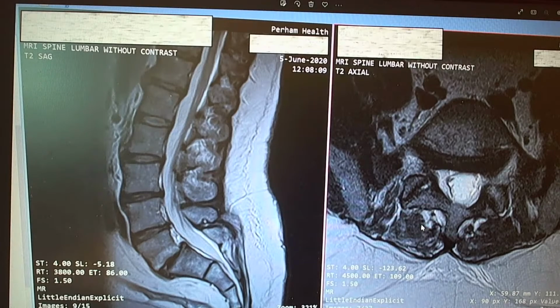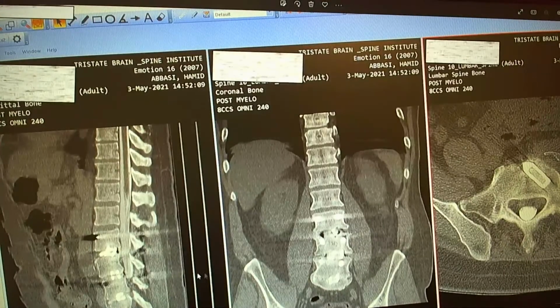Okay, I think we should stop right here. And here you see the cage again, the metal cage. This is CT, obviously, because in MRI you wouldn't see that. And you see the cauda equina, you see the conus medullaris, you see air in the large intestine. This is not air. You see the screw, it is aligned, that line, it's the so-called metal artifact from the screw. How do I know that? Look at the line that's going across, and that dark is right after the metal. So it's not a true finding, it's an artifact, the metal artifact.